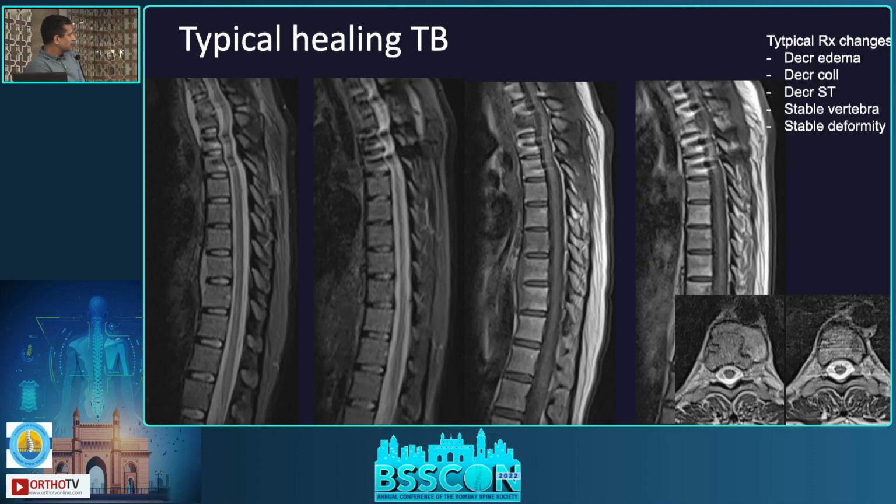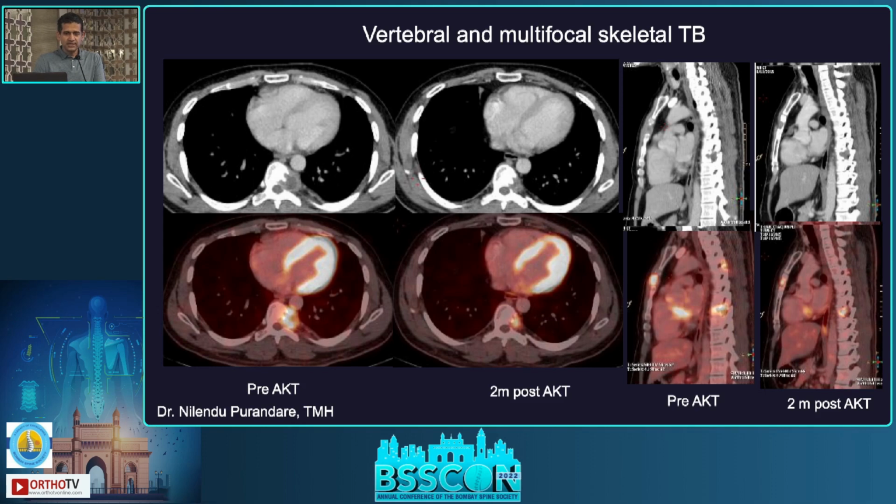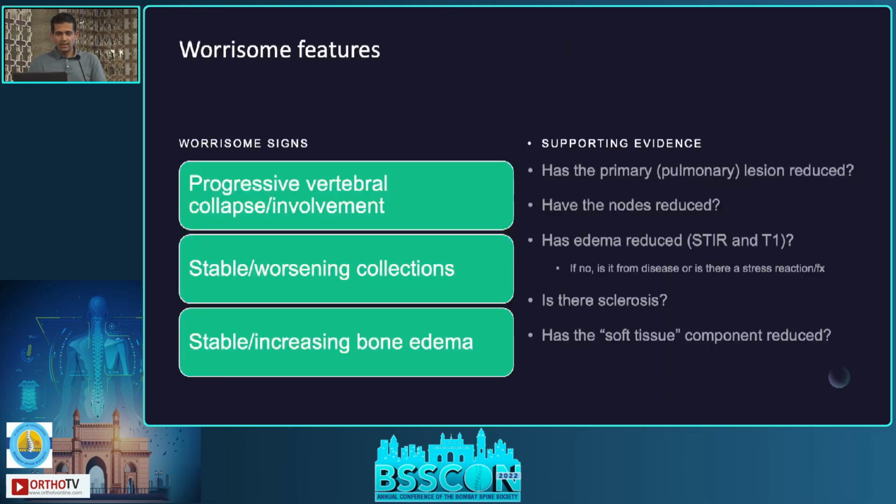So this is now a typical case of healing TB. You can see the collections reducing over time. This is a case with PET CT. You can see the metabolic activity reducing nicely over time.